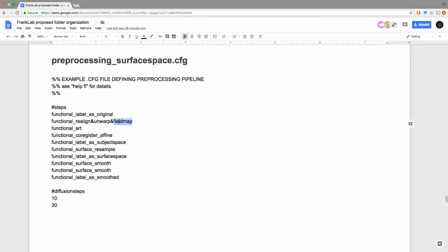Does that make sense? Yes. So we should always use unwarp. Yes, generally the recommendation is to always use unwarp.